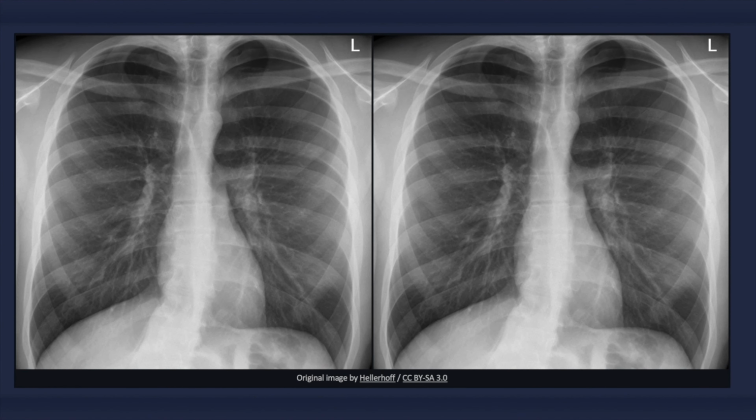A pneumothorax refers to the presence of gas or air in the pleural space. It is considered a simple pneumothorax when there isn't any mediastinal shift to the contralateral side and the patient is stable. In regards to detecting a pneumothorax, the most important aspect is simply looking for it. The X-ray may be almost entirely normal, except for a small crescent of lucency next to the lung, which can be easy to miss. Can you see a crescent of increased transradiancy in this X-ray? You may need to look closely.